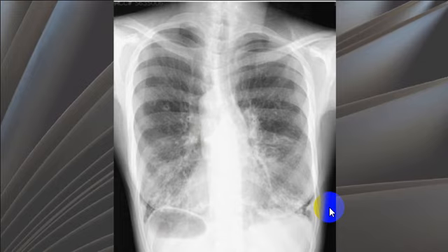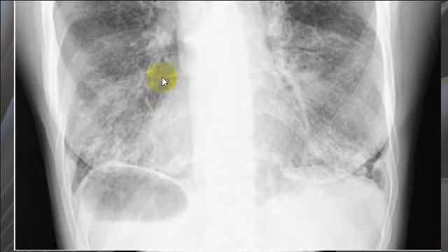And also we see some increased bronchovascular markings in both lower lobes. On the magnified view of the lower chest, we see that the tubular structures are representing slightly dilated segmental bronchi with wall thickening and some impaction in them, indicating some sort of bronchiectasis.